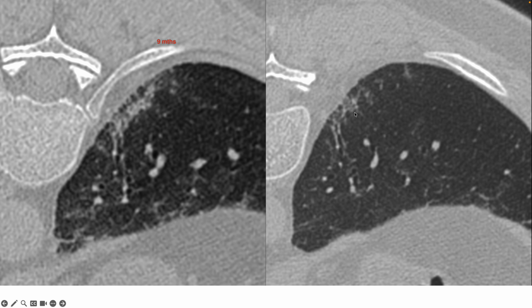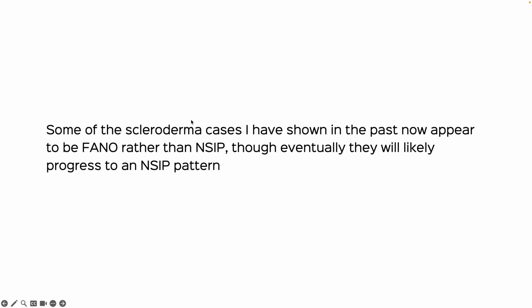These are faint amorphous nodular opacities that eventually progressed over 9 months. And those early dots and bands, the histopathology corresponds exactly to what they've described here. And then they've given references where similar findings have been seen with dermatomyositis.